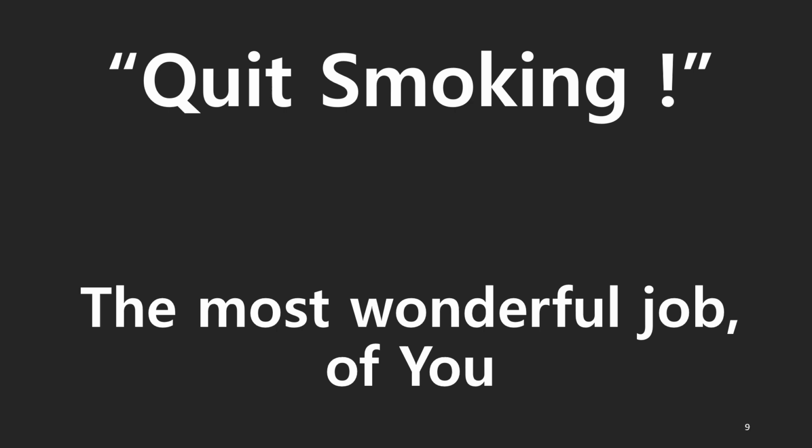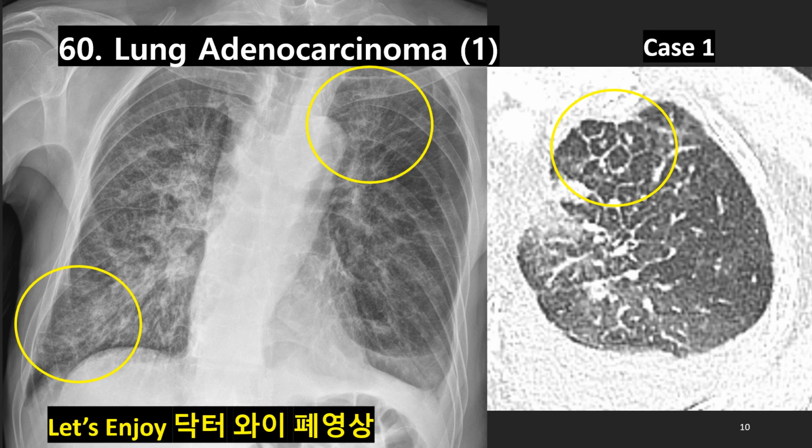Congratulations. Let's start the museum tour of lymphangitic carcinomatosis. Very characteristic and tragic findings of the chest radiograph. First case is from lung adenocarcinoma on right side. Both lungs are abnormal, most severe on the right side.